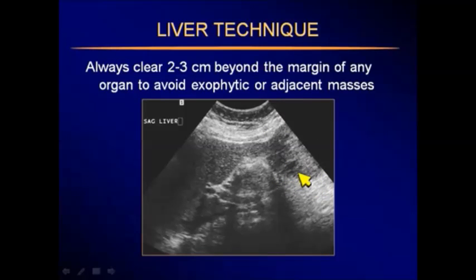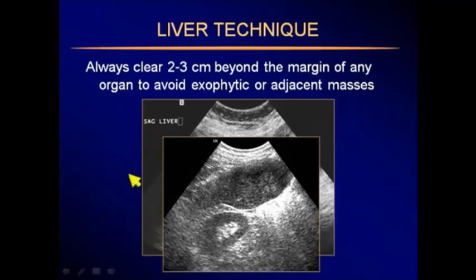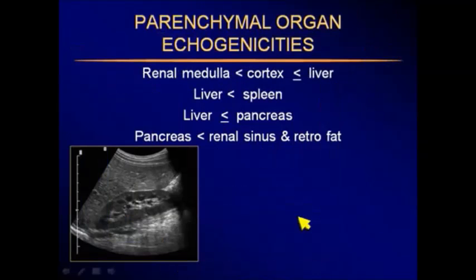of the liver. And if you think that this is an anecdotal or unusual case, here's another case that we had fairly recently. Hanging from the inferior margin of the liver was this large mass, another hepatocellular carcinoma, hepatoma, and that's the right kidney here.